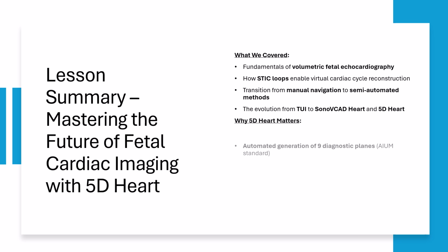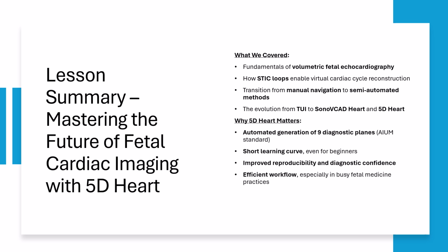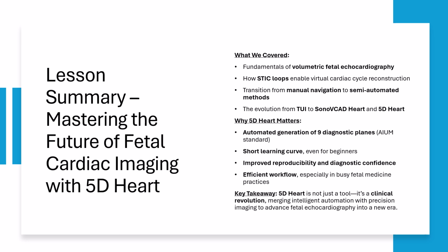So why does this matter? Because 5D Heart isn't just another imaging add-on, it's a game changer. It automates the generation of the 9 diagnostic planes in line with the AIUM guidelines. It offers a short learning curve, empowering both seasoned experts and early learners. It ensures high reproducibility and diagnostic confidence, even in challenging cases.